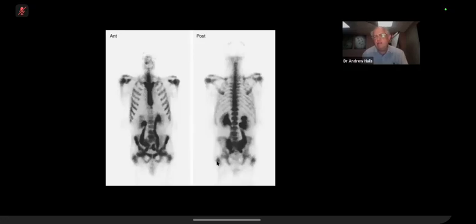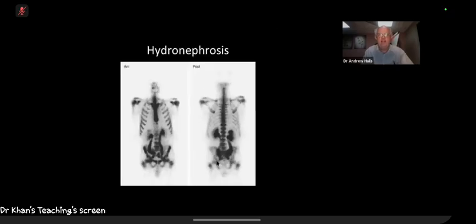Yes, that's right. Because really, this is just to show that on a bone scan, quite every now and again, not that unusually, people pick up problems with the renal tract. They pick up hydronephrosis, obstructive uropathy, which obviously they should have done the renal function and should have known, but they didn't know. So this just demonstrates that you see that, and then you have to be very careful in your report to mention this looks like an obstructive uropathy. I suggest maybe an ultrasound of the abdomen. I'll obviously check renal function as well. Maybe not just hydronephrosis.